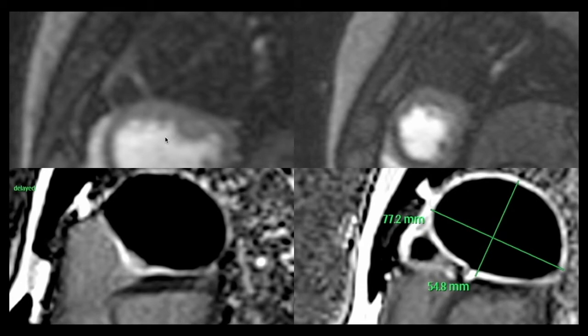No contrast extravasation was seen in the dynamic perfusion scan too, and late gadolinium enhancement is showing a thin capsule of enhancement and water intensity within the cystic lesion with a well-defined thick wall, which was confirmed again by CT angiography, suggesting a pericardial cyst with high proteinaceous content but causing mild pressure effect on the ventricular cavity. So describing a mass, describing its attachment is more important rather than directly reaching a conclusion.